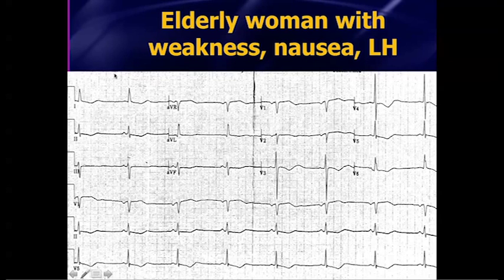If it's coming from the sinus node, you ought to have upright P waves in 1, 2, 3, aVF and inverted in aVR. If you don't, if you've got inverted P waves in any of these leads, or an upright P wave in aVR, then that's called an ectopic atrial rhythm. All right, so anyway, just some semantics. There's a little bit of high voltage out here. It's kind of non-specific.